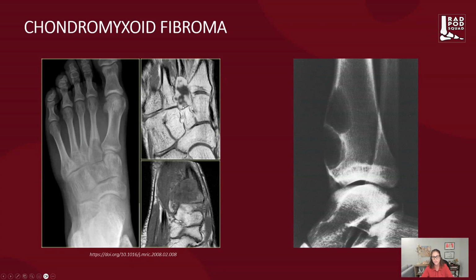And in the central region here, notice this irregular T1 pre-contrast signal and the post-contrast enhancing rim. The fact that it is not thin and regular is suspicious and will require a resection to prove what the actual tissue in this lesion is.